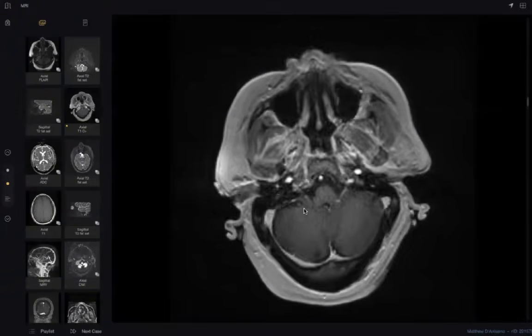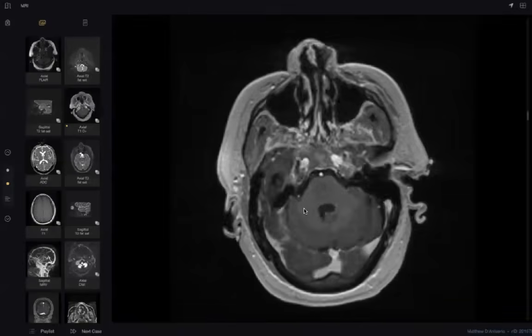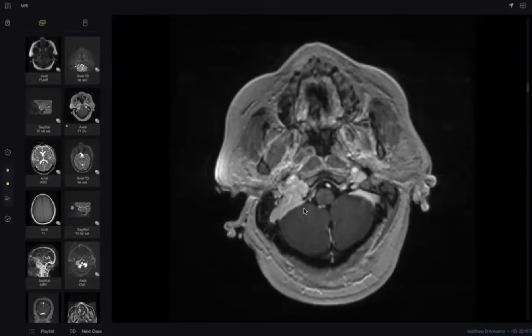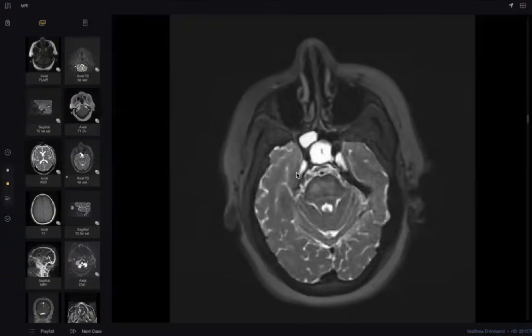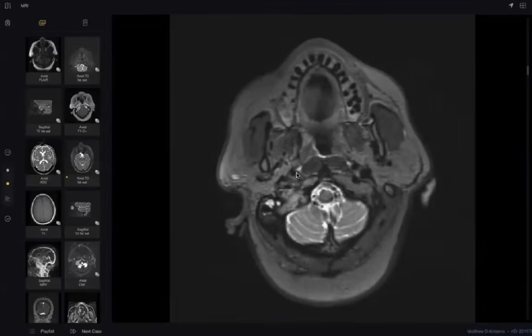This is the inner ear, yes or no? I think no. Okay. Why does this lesion not show edema? Do you have any clue or suggestive sign? Yes, sir. I saw a signal void area in this lesion, on the T2 images. Multiple signal voids are seen.